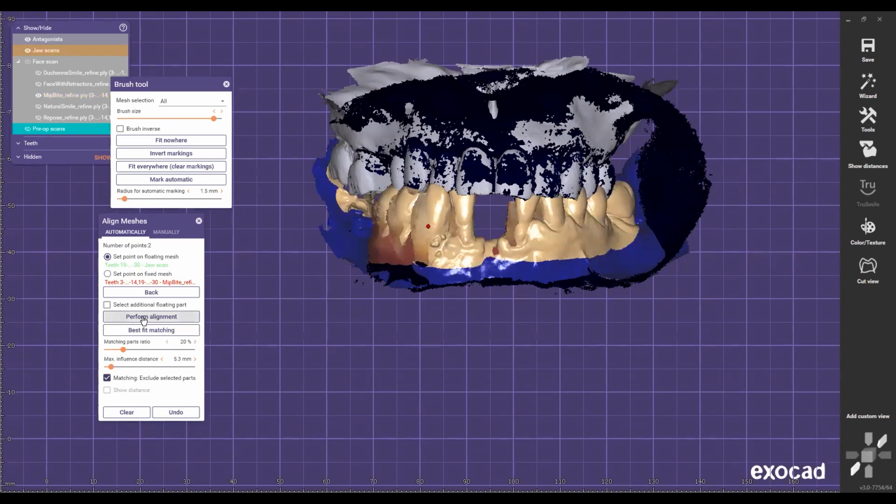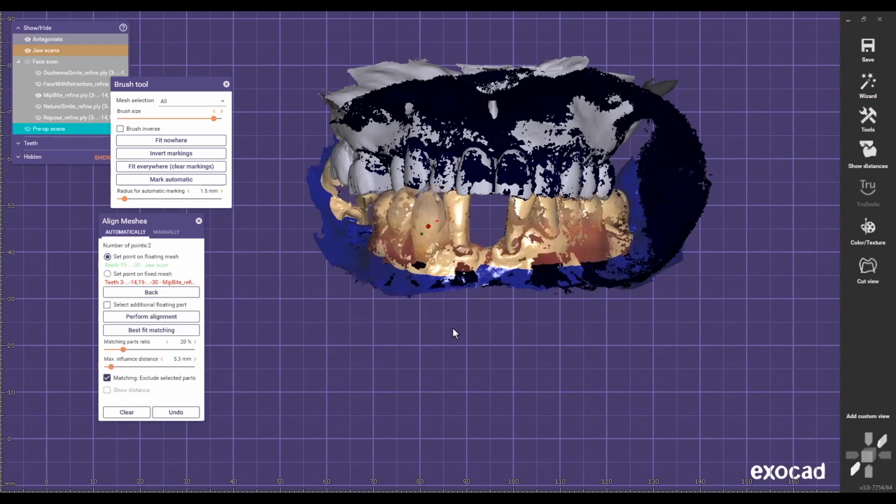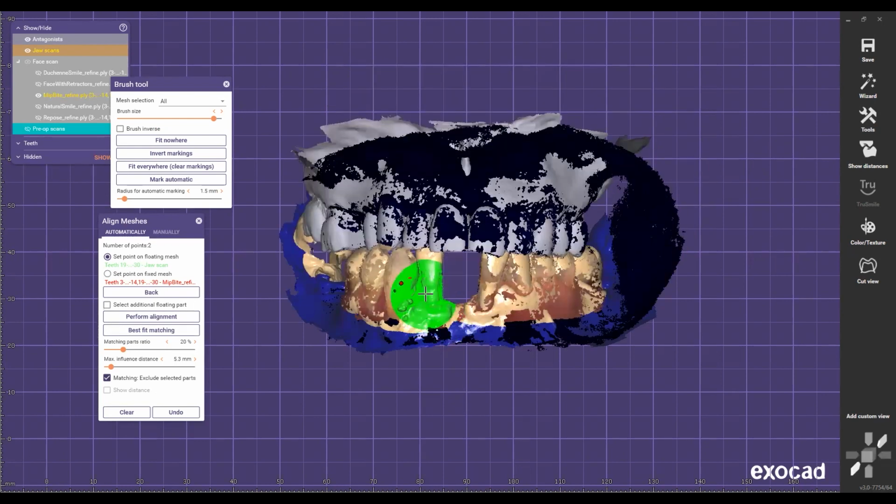So we have to make sure that we get a really good bite, for us to be able to deliver a precise bite the day of surgery, when we deliver that immediate loading All-on-X, or full mouth reconstruction crown and bridge, or when we deliver overdentures. We're able to nail the occlusion because our facial scanner is a bite scanner.